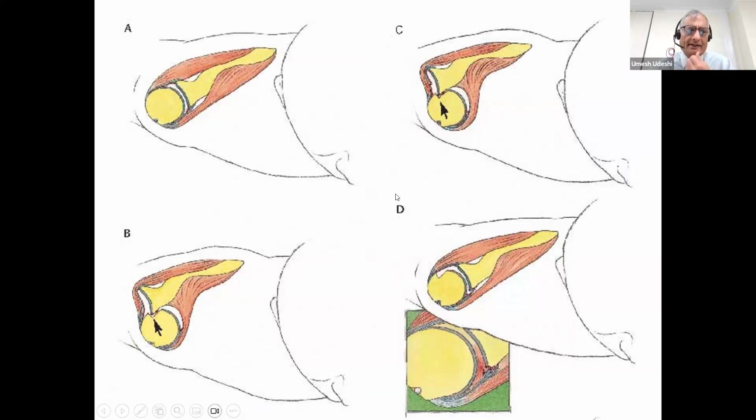So here's what you might see. This is the axial representation. The nose is here at the front, so this is anterior, that's posterior, axial images. So that's a normal glenohumeral joint and labrum. Here's one that's dislocated. So there's a Hill-Sachs defect. Even a single dislocation can give rise to a bony defect like that visible.